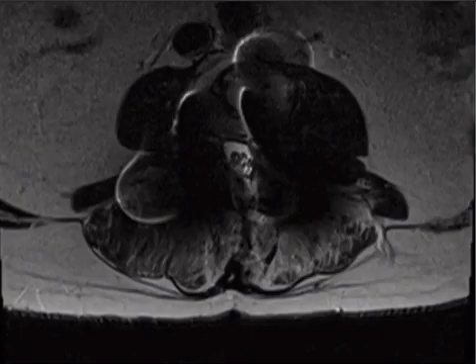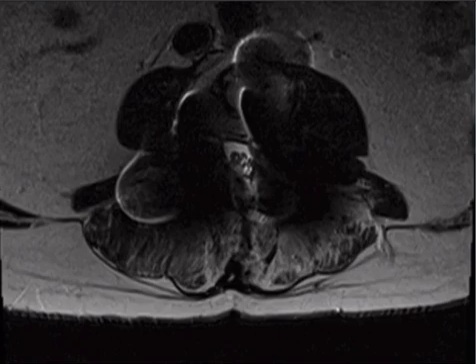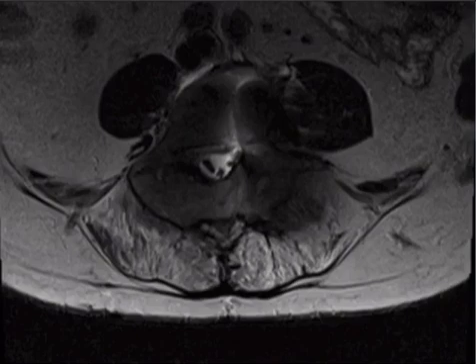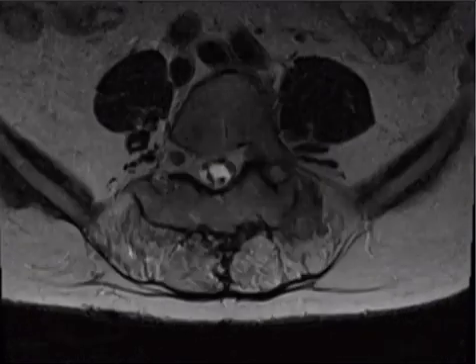All right, next case is another post-op case, and I deliberately picked one that had all this metal artifact, so get in your mind, when you see post-op spine cases, you need to be thinking about post-op scar like that, or you need to be thinking about this. So, obscured. Okay, now look at those nerve roots.